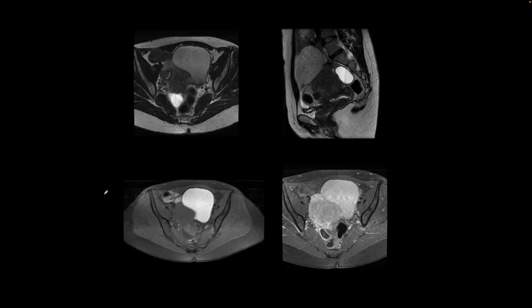This is our next patient where we have performed an MRI of the pelvis in a female, and we see part of the endometrium here. The uterus appears to be retroverted there. Here's the urinary bladder, T2 hyperintense urine inside. Well, maybe it is seen right here.